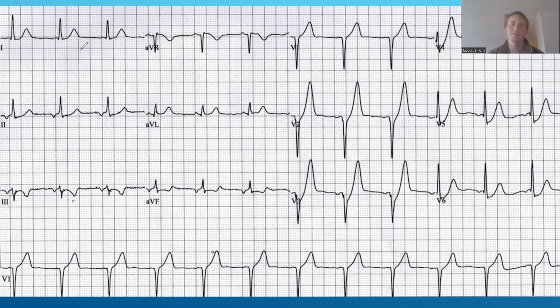I don't know if anyone else does this, but I refer to the high lateral leads as I and aVL and the low lateral leads as V5, V6, whereas I know some people just refer to all of them as the lateral leads. The reason I do that is because I and aVL are reciprocal. They're opposite of the inferior leads. In fact, aVL is completely opposite of the inferior leads. So I think it helps me in my head sort of remember that high lateral is going to be where the reciprocal changes from inferior are. But a bit of a side.